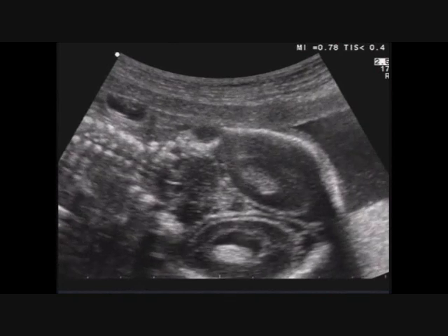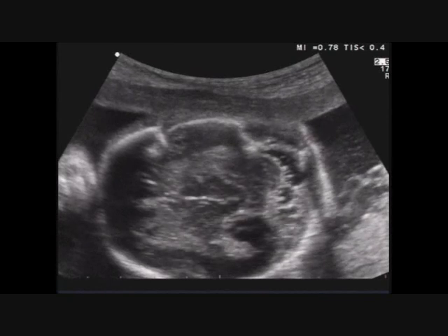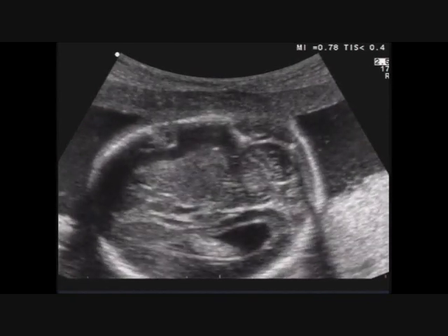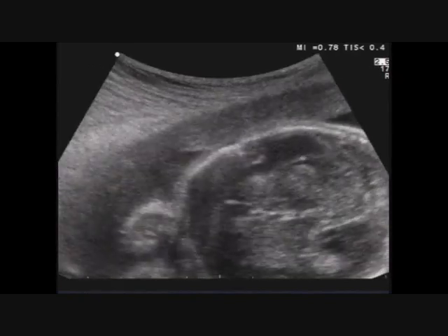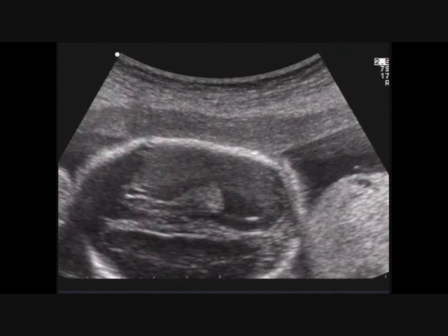The absence of visualization of the cavum septum pellucidum is the most important sign, but you can find other signs such as colpocephaly. You know that the occipital horns are more swollen than normal. In this case, the value is 9 mm. That is a normal value. But I show you this sign because you can find values of 11-12 mm, typical of this malformation.